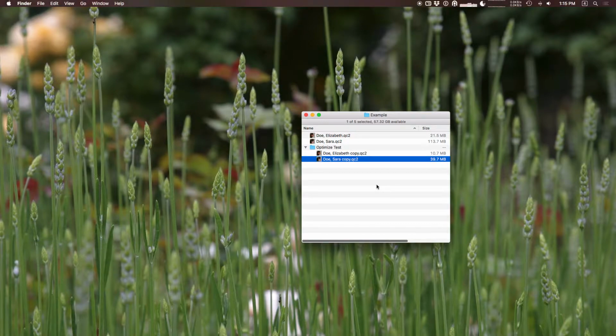So we really felt we've just seen so many of these files with extra large photos, photos that are much larger than they actually need to be. So we felt this was a good way to bring the photos into a more reasonable size. It still provides plenty of quality, and it's going to save a lot of hard drive space. Not only will this save hard drive space, but especially if you're working with integration or if you store these files across the network, having smaller file sizes will make opening and saving those files go quicker as well.